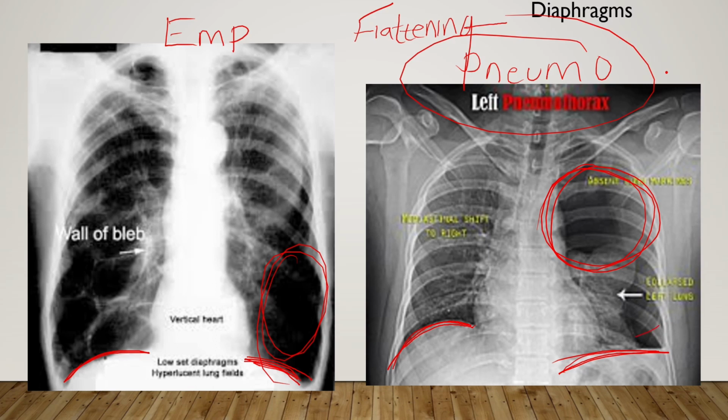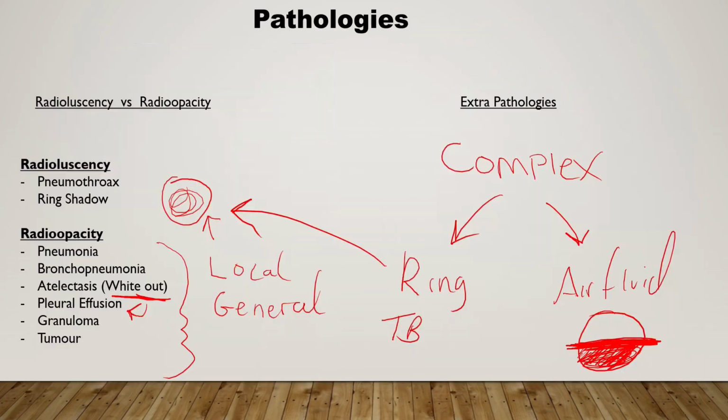What can we also see? Oh, we also see some radiolucency, this shadowing. There's no lung markings. All right, it's probably pneumothorax. And when you think of pneumothorax, all right, let's look at the trachea. Is there tension? Is it moving towards the other side? Or is it staying the same? Is it just a normal closed or open pneumothorax? Yada, yada, yada, you know what I mean.